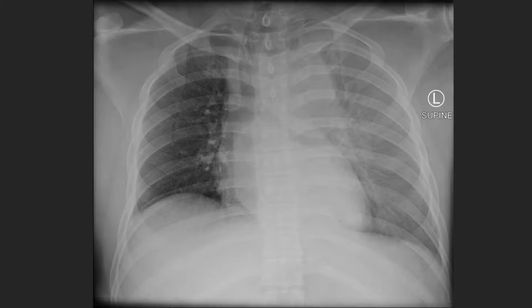Here's another case of a very abnormal appearing aorta. The ascending aorta looks to be okay, as it does not appear to be protruding beyond the right atrial border. But what about the aortic arch? It looks very abnormal. It is poorly defined, has an irregular border, and appears enlarged. Also notice how wide the mediastinum is, much too wide even for a patient lying flat. Just as important, the mediastinum is not only wide, but just too dense and too white. This tells us that something may be accumulating there.